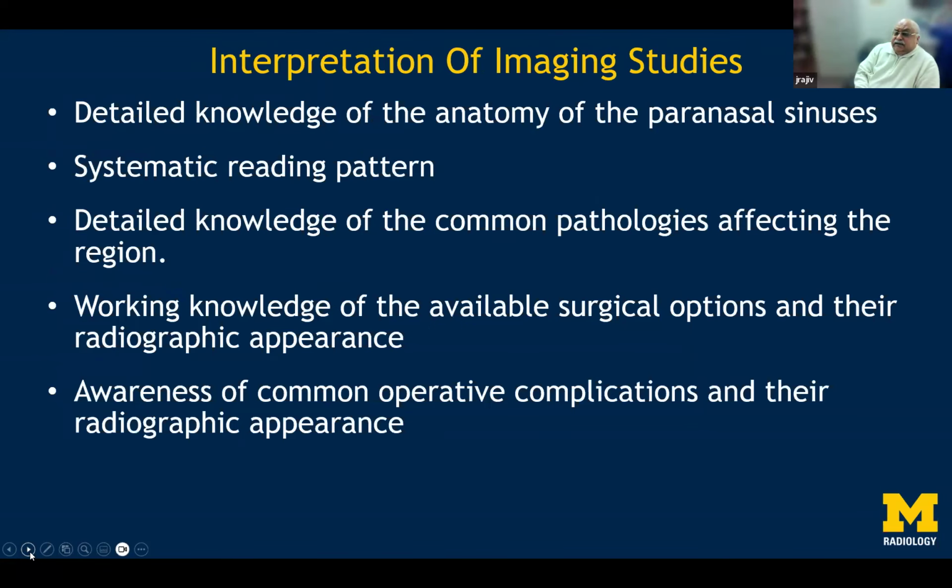So one should have a detailed knowledge about the anatomy of the sinuses before we actually start looking at the structures, and the reading pattern also has to be a little bit streamlined. So I understand each section of the paranasal sinuses so that the assessment is carried out in a very expert manner, and it takes a few minutes to go through the entire section once you have got the hang of looking at the images.